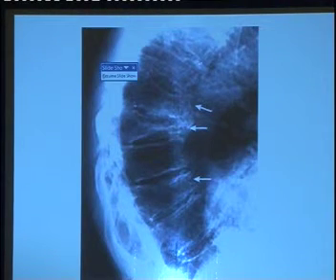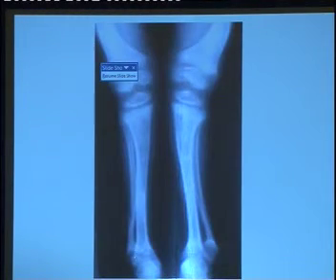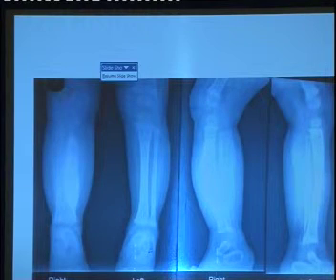I told you that the quality of the bone should be assessed. Quality of the bone, as you have already seen: thin cortex and there is some wedging. It is osteoporosis with wedging. It is another aspect; everybody will be able to answer. Rickets, nutritional rickets. And in the healing, there is some calcification going on. This is not a good X-ray.